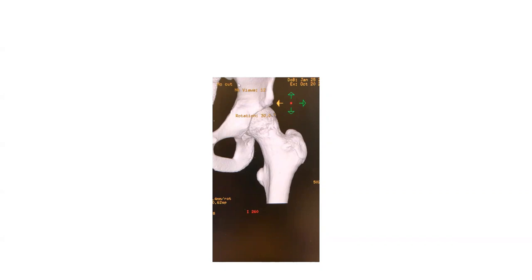If you don't take it out, they are subject to fracture risk at the end of the plate, where there is a difference in the modulus of elasticity, for my engineers, between the bone and the metal. That interface can concentrate stress and potentially break. And you really have to look at the studies and say what's pro and con.